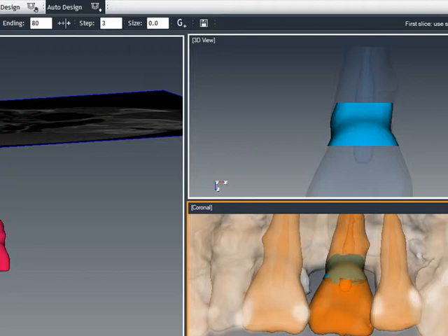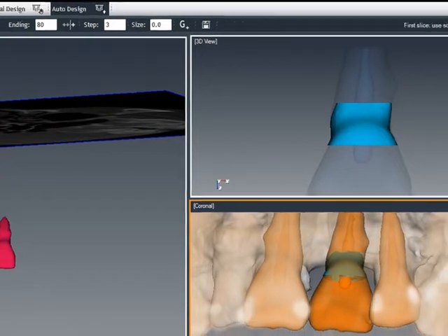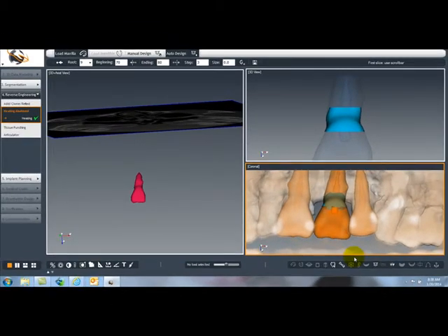papilla support, etc. In fact, it's easier. You don't have to put the final abutment immediately, but you can try it at the time of the surgery, and at the time of the exposure, you can put the final abutment with a temporary crown on it, and you will be sculpting the tissue perfectly to the ideal emergence profile of the natural root next to it.